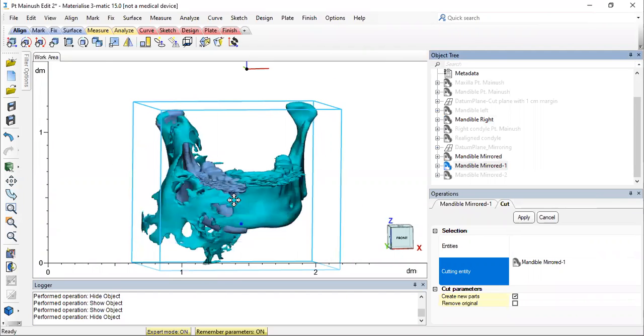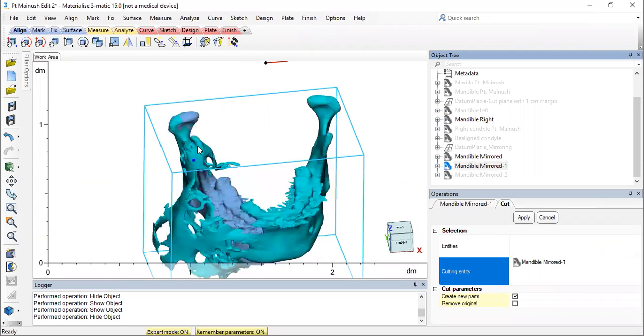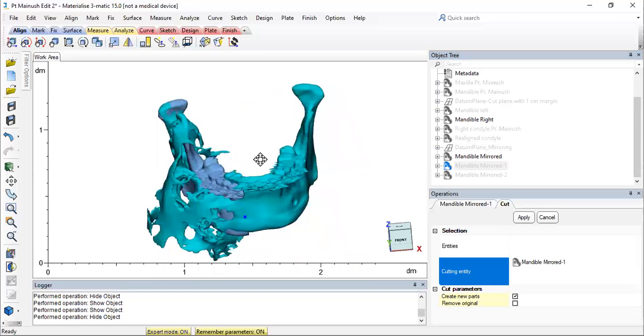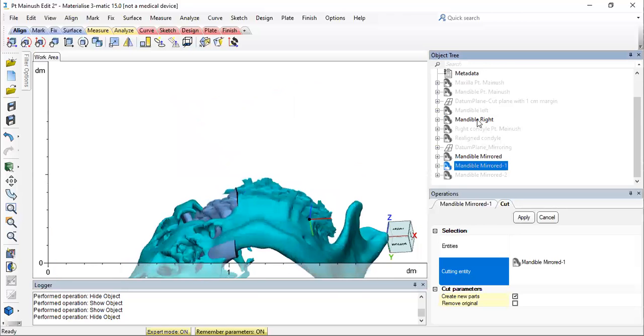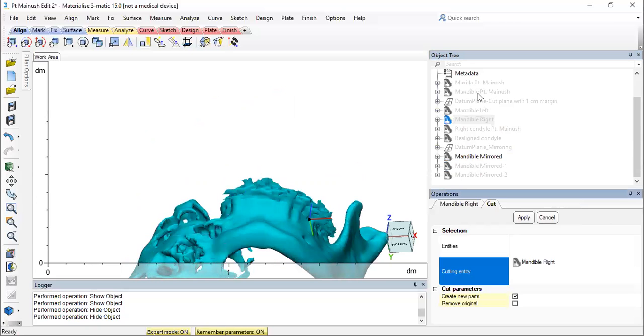And why is point registration difficult? Because you have reversed the sides, like left is right, right is left, right? So again your points will not match correctly. You can take the help of your chin point but it will not help much. If you like, I'll do global registration once, because there are not many points to match. We can still do global registration.